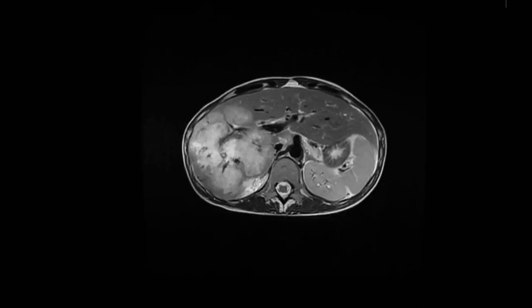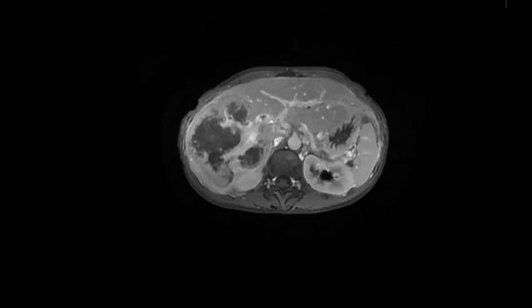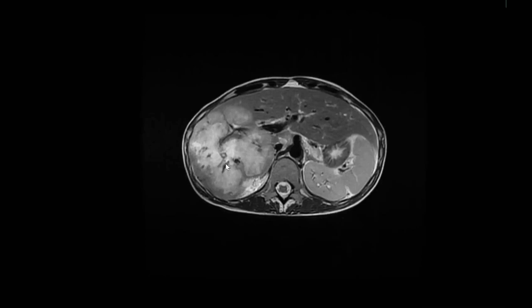Okay, so this is a T2 weighted axial image of the liver. On this, I can see that the lesion is giving mixed intensity, hyperintense to liver, and its periphery is irregular. So in this case, my differential would be cholangiocarcinoma, and I would like to check the diffusion weighted image to see if it's an abscess. Excellent. This tumor has intermediate signal intensity near to the spleen. That indicates it is not fluid. This is tumor signal intensity, not abscess.